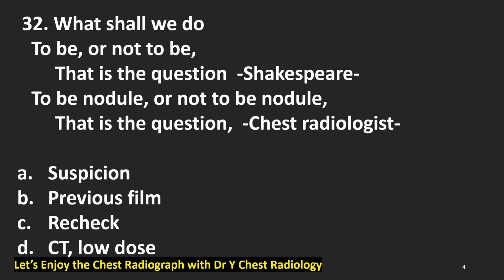What should we do when faced with pseudopulmonary nodule? Shakespeare told before, to be or not to be, that is the question. We, the chest radiologists, may have to say, to be nodule or not to be nodule, that is the question.